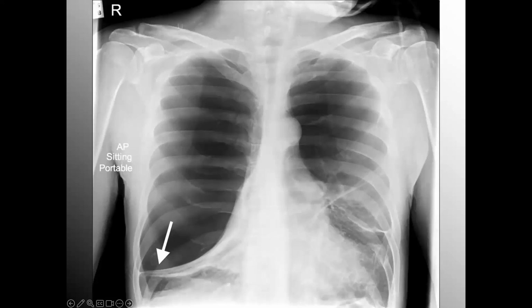So it's unfortunate, but it's not a pneumothorax. This is bullous disease. How do I differentiate it from a pneumothorax? Well, I'll back up, let you see it here. A pneumothorax is not going to allow this perfect encapsulation of air unless you have significant adhesions, but even an adhesion is not going to keep air from escaping around that scar tissue into the different cavitary regions of the thorax. So it's just too linear here, and I don't see a compressed lung.